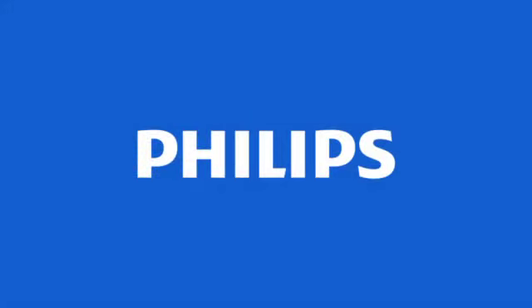I hope this showed you how easy it is to scan MR conditional implants with confidence on Philips MR systems. This is just one way Philips is leaning in on MR safety. In addition to the new reimbursement codes, ScanWise Implant provides an incentive to scan patients with implants, as well as confidence that it can be done safely and consistently. Thank you for your time.